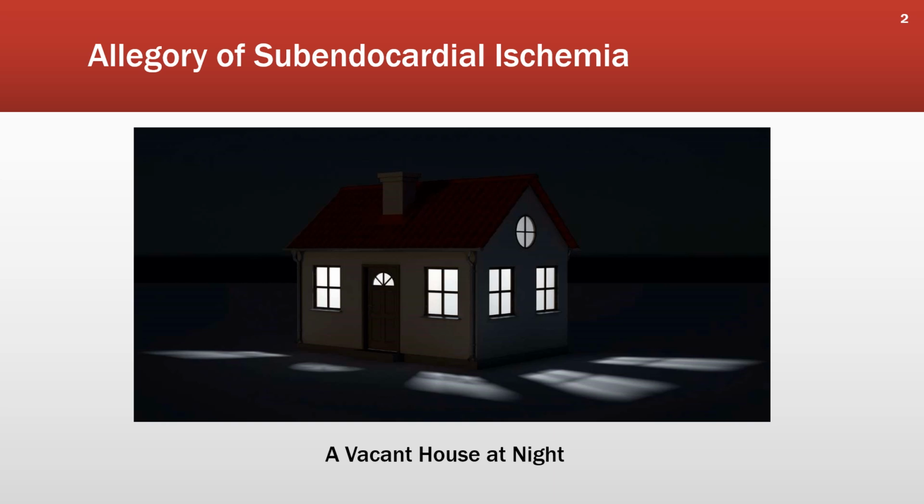Then a number of years ago, some disturbing information began to surface in various medical journals around the globe. Sometimes ST depression that was limited to just leads 2, 3, and AVF, for example, didn't reveal any actual subendocardial ischemia in the inferior wall of the left ventricle. In some cases, subendocardial ischemia was indeed present, but very little involved the inferior wall, and most of the ischemia was elsewhere. But the only ST depression present was in the inferior leads. Some articles began mentioning the same findings regarding ST depression in other leads as well.